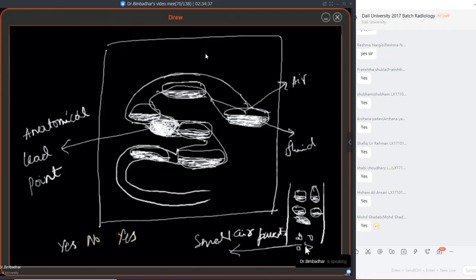So by this I localized myself: yes, it is present down in the small intestine itself. So obviously my picture is looking down at the small intestine itself, right? Whether I understand the concept, or I answer yes or no to these questions, I will be able to make the particular diagnosis. Is this concept clear, guys? Yes?